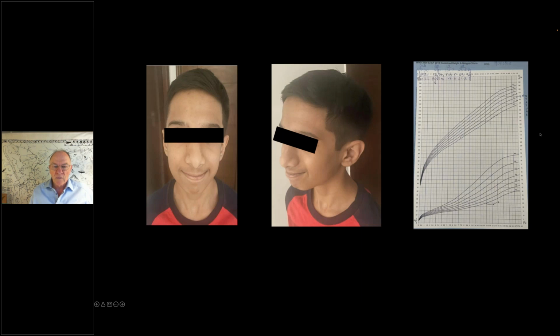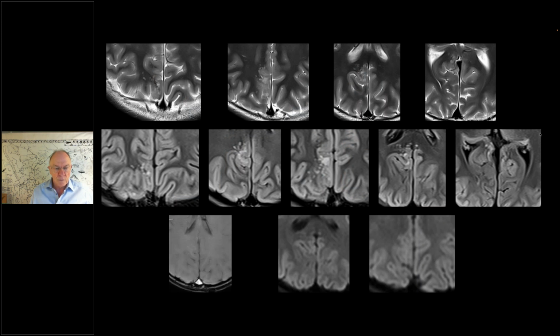Okay. So move on to the images. Here is the incidentally detected lesion. We have the T2 weighted sequence on top, the axial images. And if you appreciate on the right parietal subcortical areas, you have these tiny areas of T2 hyperintensities. Again over here, slightly abutting the cortex. Posterior to the splenium of the corpus callosum, again these tiny T2 hyperintensities.